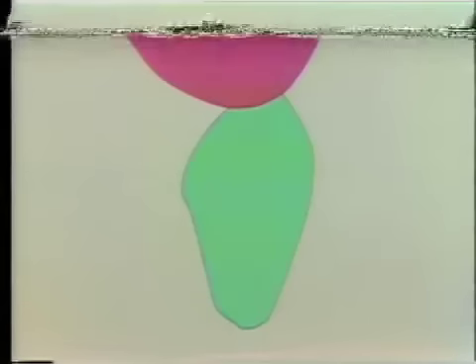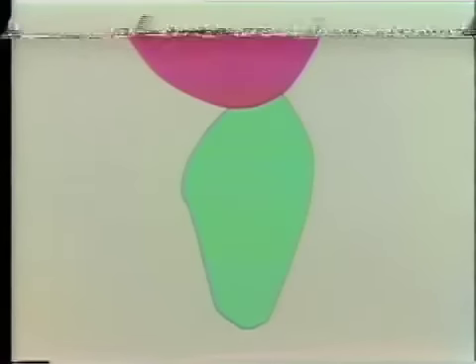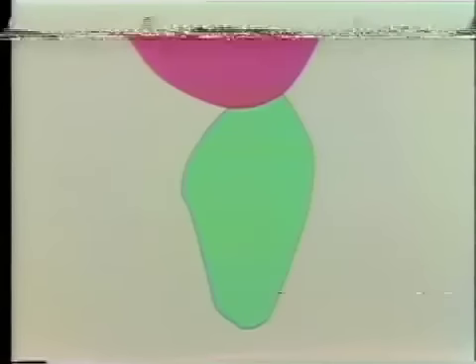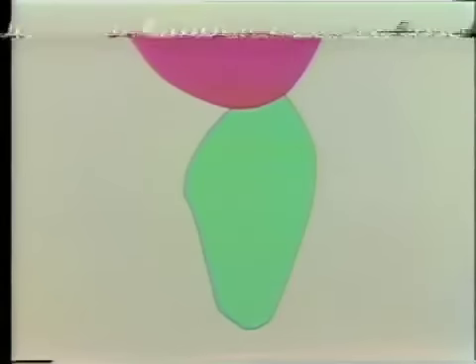An anterior Pontic developed along the lines described in these diagrams would lead to a relationship between the Pontic and the alveolar ridge, such as is shown in this diagram here. This is described as the ridge lap type of Pontic.